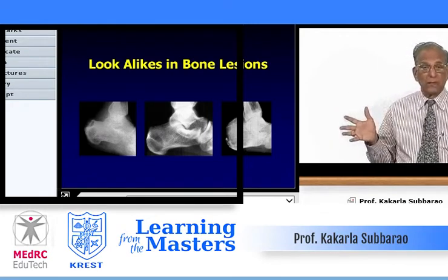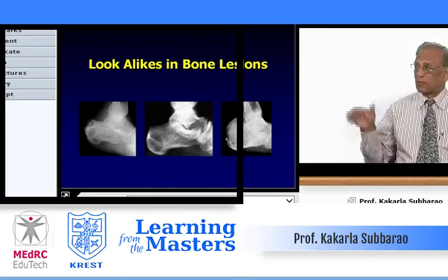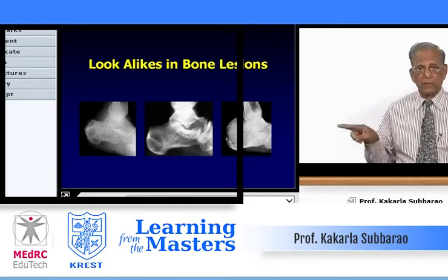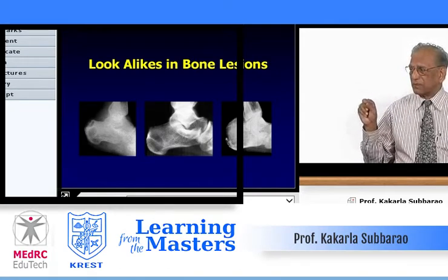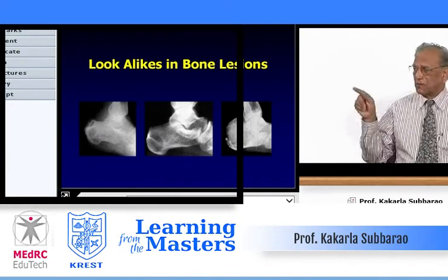Not only they occur in the epiphysis, they can occur in the apophysis also. Of course, here the apophysis is rather closed, just closed. The two pictures below, one on the left side is multiple lytic areas. In adult, there is some osteoporosis of the bones. And then if we look at the subtalar joint, it is obliterated.